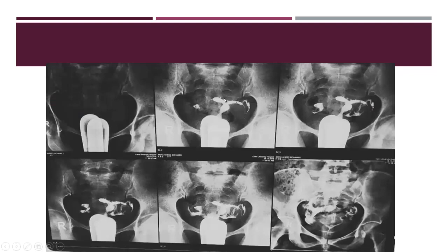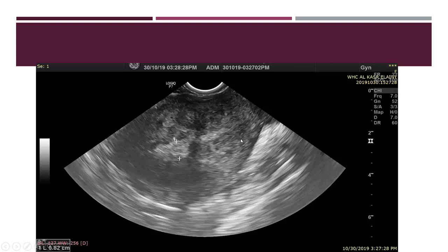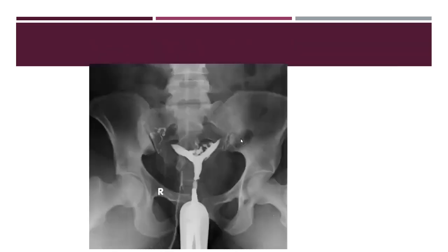This is typical for adenomyosis. This is the endometrial glands outpouching from the surface of the uterus. And this is cicatricial contraction mimicking duplicated uterine cavity. Again, typical appearance of adenomyosis. Also, there is either a duplicated uterine cavity or maybe focal adenomyosis causes extrinsic indentation on the fundus of the uterus.